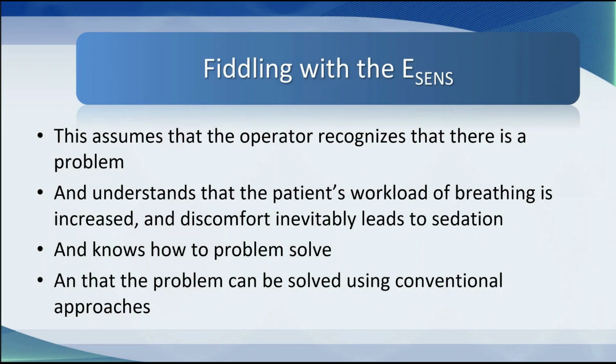In most ICUs, the bedside attendant rarely changes the expiratory sensitivity, and that's an issue because the operator really needs to understand that there is a problem and understands that the patient's workload of breathing is increased. It's increased because they're not getting flow when they want it.